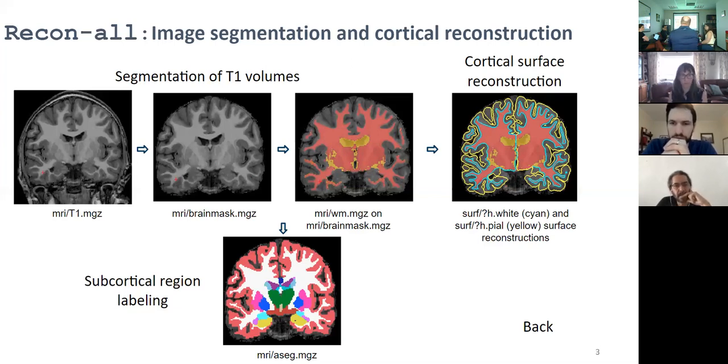It's essentially you're coming up with these self-contained regions. So you've got white matter, right? And you've got the whole thalamus, and you've got the whole cortex. But we know that even though the whole cortex is uniform in terms of its intensity in a T1, it's certainly not uniform in its function.